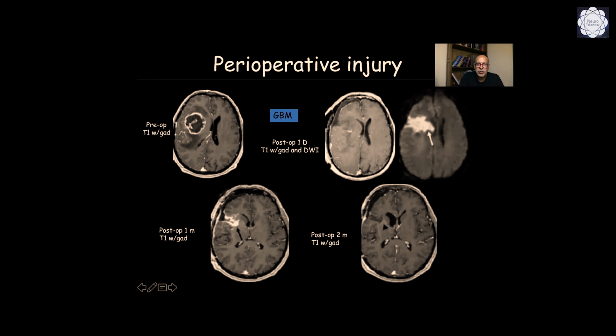You know that we try to study the patients very, very soon after surgery. In general, it is said that in the first 48 hours, that's the right time to study our patients, because in that period there is no scar enhancement. But on 3T, maybe that's not true. Maybe you can find early enhancement, and in those cases you have to trust the shape and the place of the enhancement.